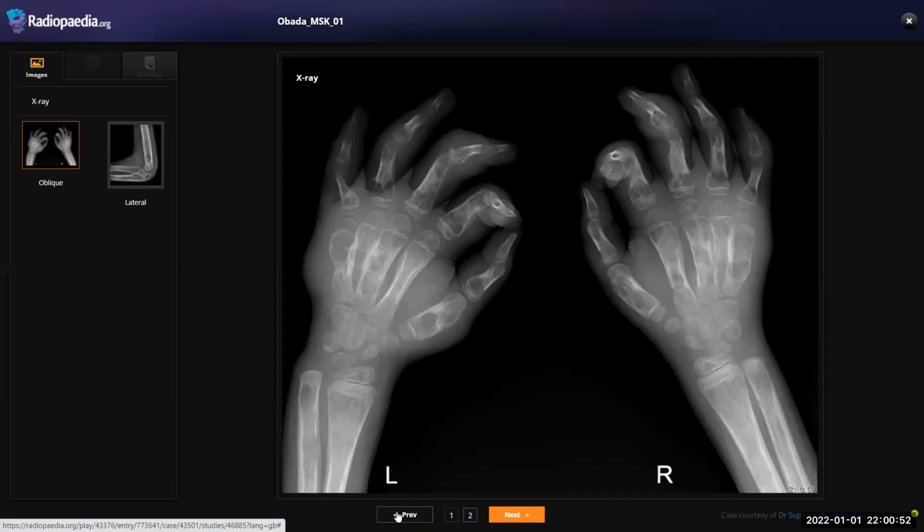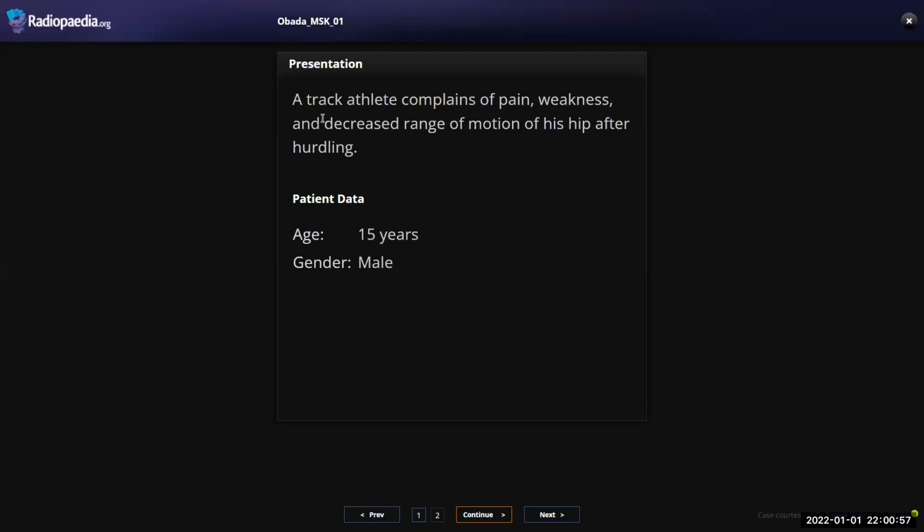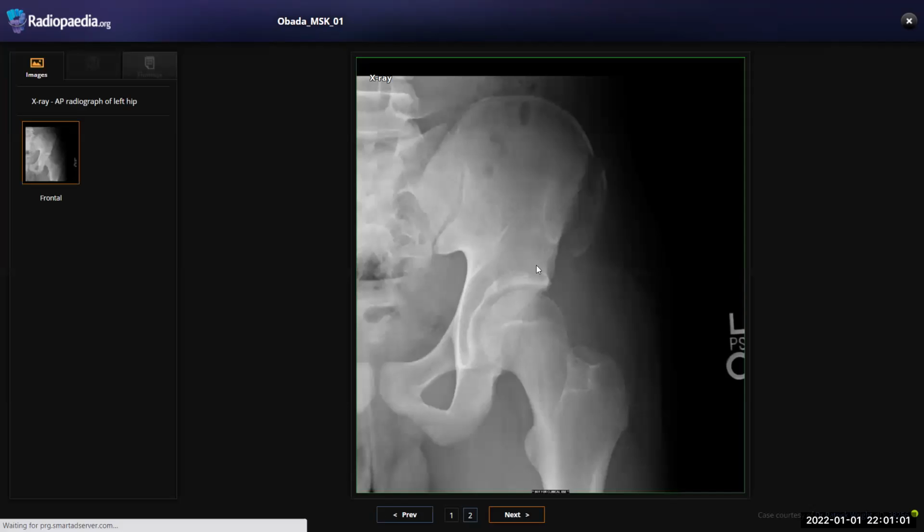Okay. Previous. Okay, this case is also very nice. When cases are easy to detect, I think more about the knowledge they will ask you, what to do.